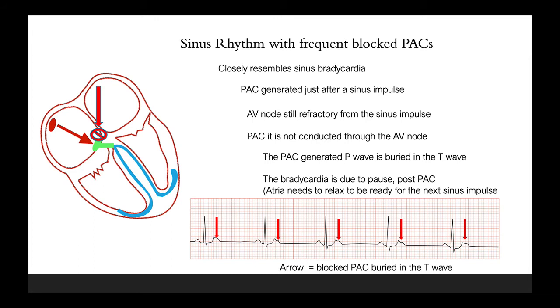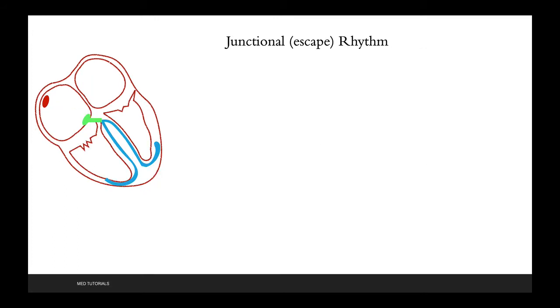So in cases of sinus bradycardia, always look at the T wave to see is there any buried PACs which might actually be the cause of the bradycardia.